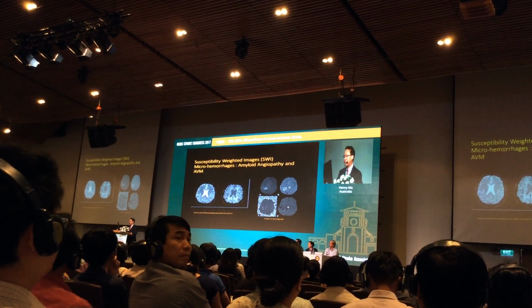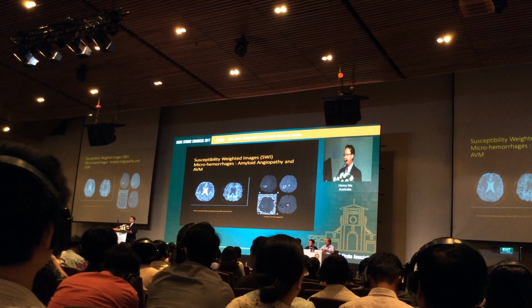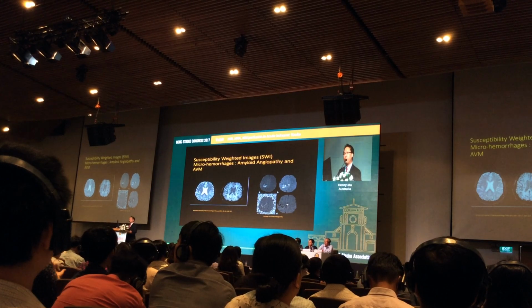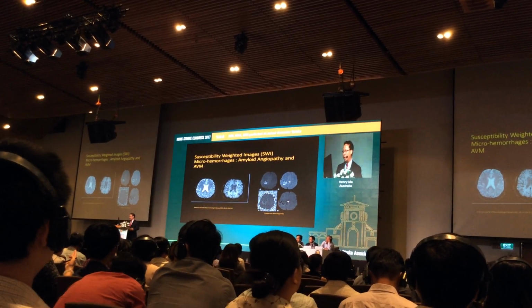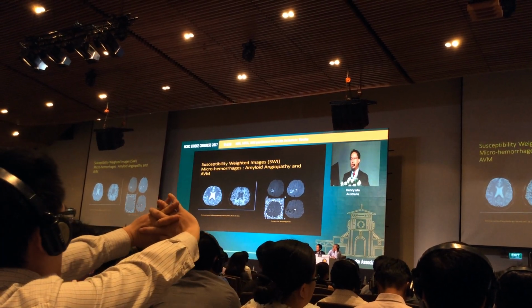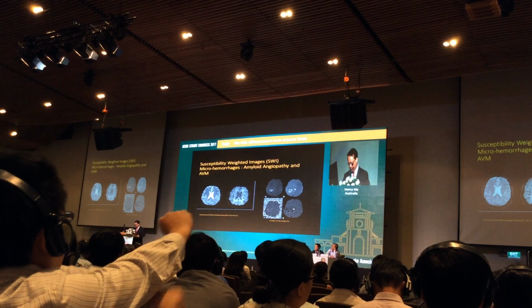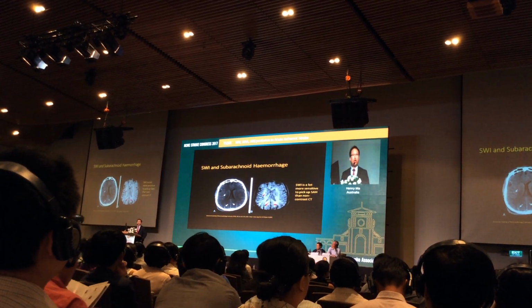So if you can see within picture C, there's brightness and darkness. By using that what I call MIP sequence, you can actually tell old or new blood, but that's a bit more complicated. But in fact, in D, you can see this patient also has subarachnoid blood too. So we talked about just using non-contrast CT.